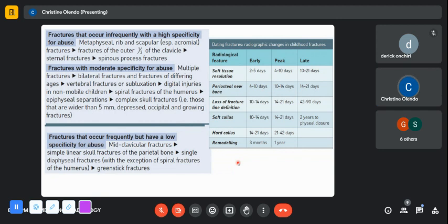And I guess for the dating, when you're using that skeletal age, if they really wanted to know when this fracture actually happened, this is where the table will come in useful. If you had one fracture, then you can look at it and say where you think it falls, and then you can try and place it.